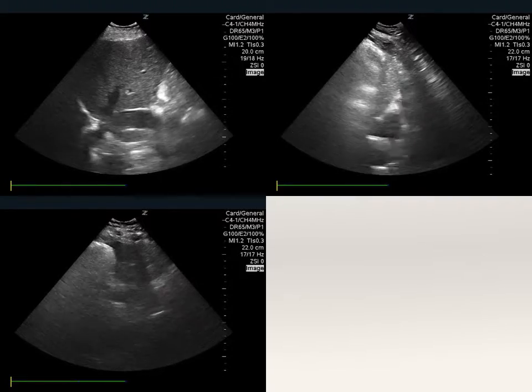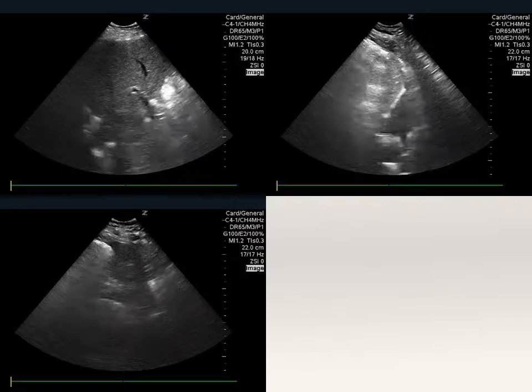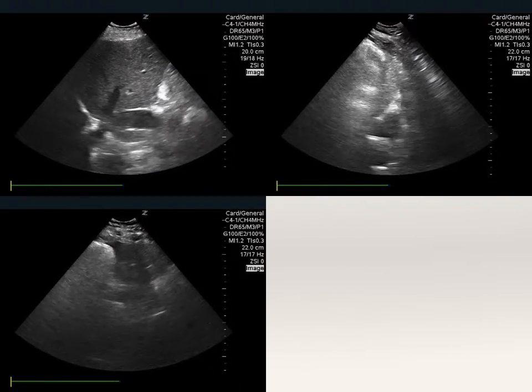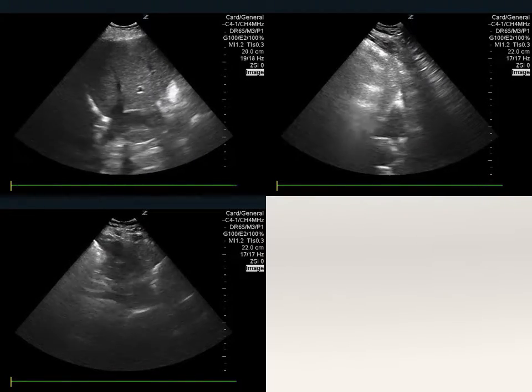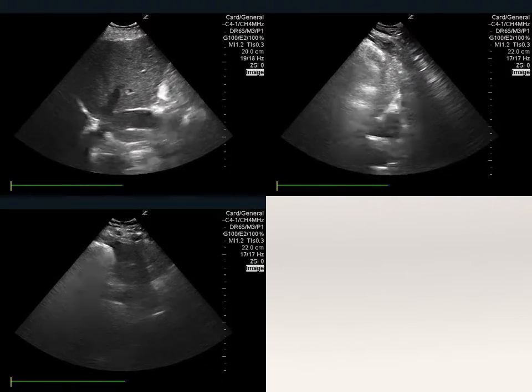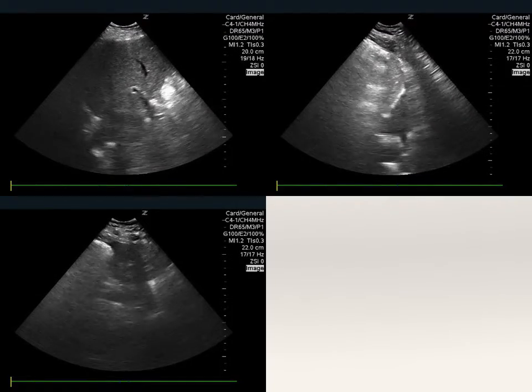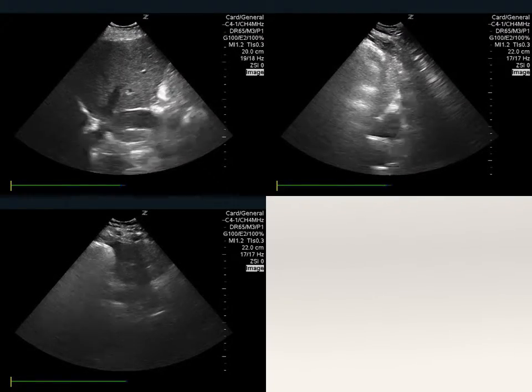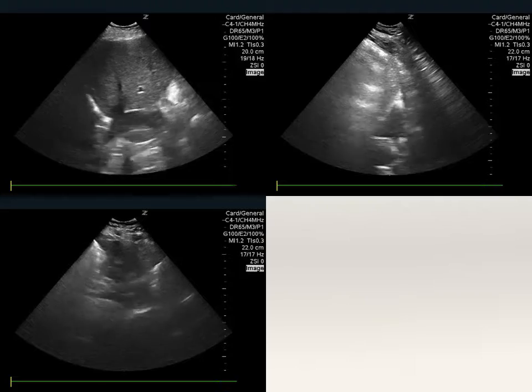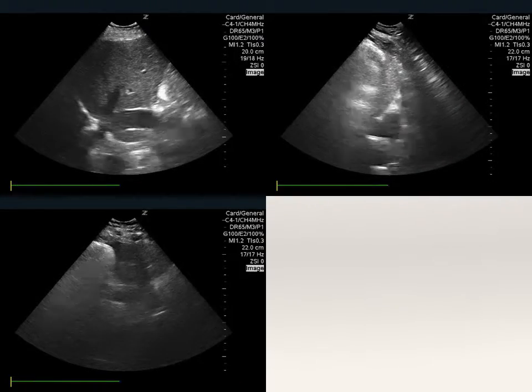This slide here is showing all three views from the same patient, the left upper being the lateral approach, the right upper being the sagittal view from an anterior approach, but only seeing that part that's just spilling into the right atrium, and finally the bottom left showing what the IVC looks like when we've moved back from the right atrium a couple centimeters. Well, why is it that the IVC acts like this?